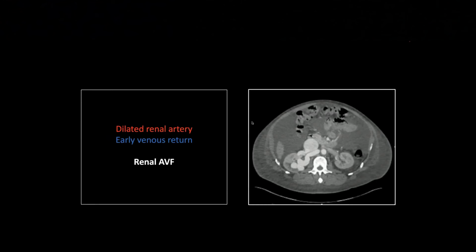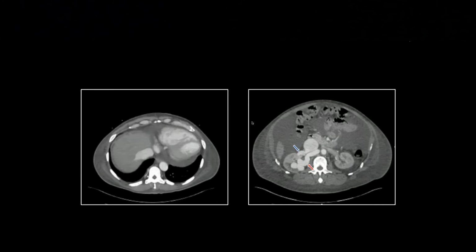Aha! So here is an actual renal AVF. So you can see this results in enlargement of all the involved vessels, right? The veins enlarge because they're seeing arterial pressure flow, and the artery will eventually enlarge due to the sumping effect of the enlarged vein. So ultimately, you will get enlarged arteries and veins feeding these renal AVFs. So this is actually the dilated renal artery, and then this is the renal vein. And look at the size of the IVC, which is receiving that arterial pressure inflow.